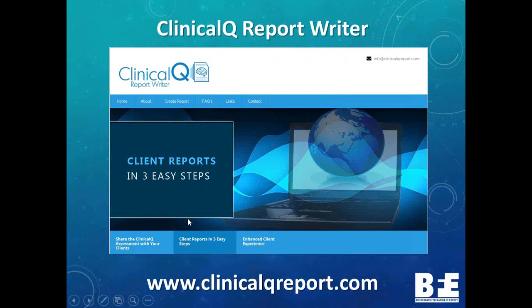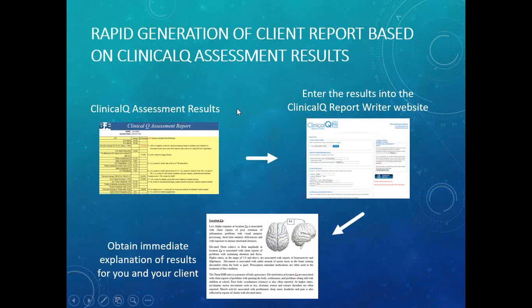This ClinicalQ Report Writer, as you might guess, because I put a little internet link at the bottom, is an online program. Anyone in the world following Dr. Swingle's ClinicalQ assessment method can take the results from their individual assessments with the client, put them into this website, and immediately get that client report and summary right back so they can read it and hand it to their client. That makes this assessment and treatment method that much easier for an average person to understand, and that much easier to follow up with training and going through the full program.